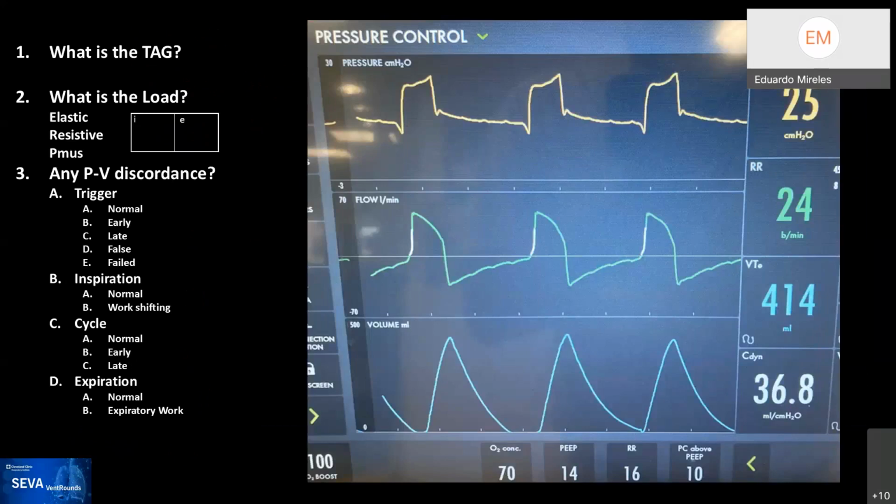All right. Okay, here's another one. This is from a live patient without any sabotage. Right? So, is there anybody that wants to read it in the room? So this looks like starting with a trigger. Looks like pressure. All the breaths are cycled by the machine, triggered by the patient, cycled by the machine.